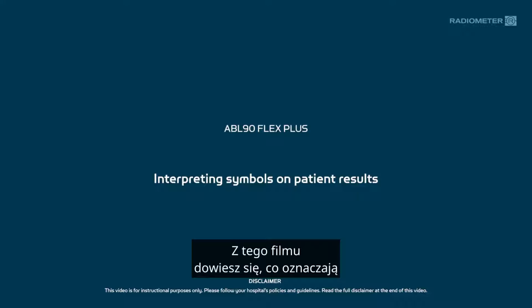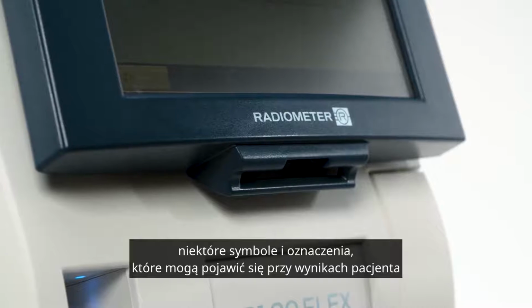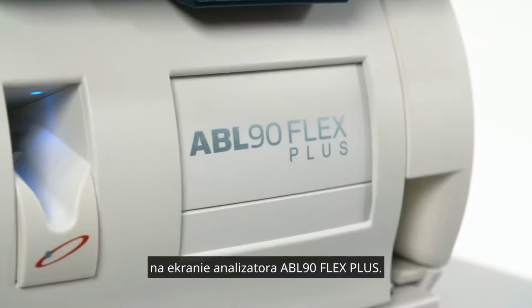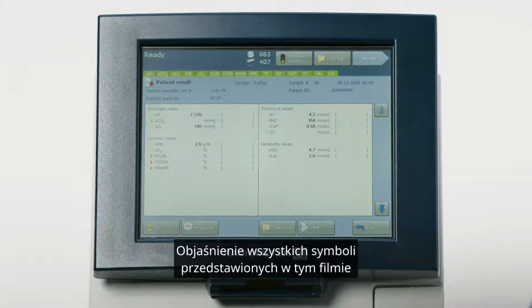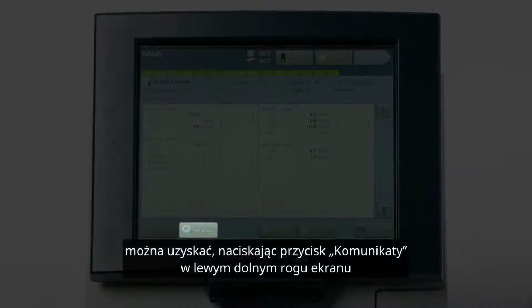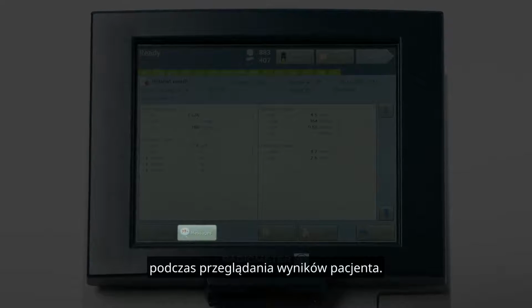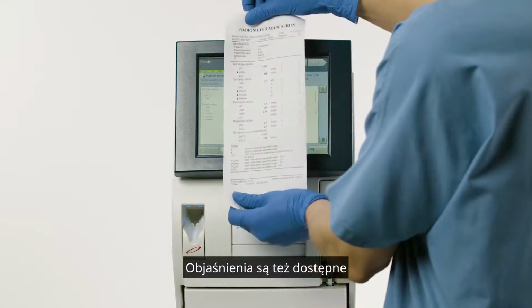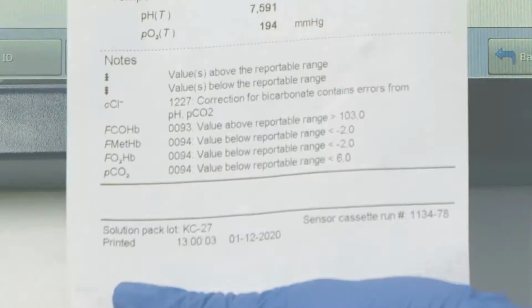In this video, you will learn how to interpret some of the symbols and notations that may appear in a patient result on the ABL90 FLEX PLUS analyzer. For an explanation of all symbols discussed in this video, tap the Messages button at the bottom left corner of the screen when you are viewing a patient result. You can also see the explanation under the Notes section of a patient result printout.